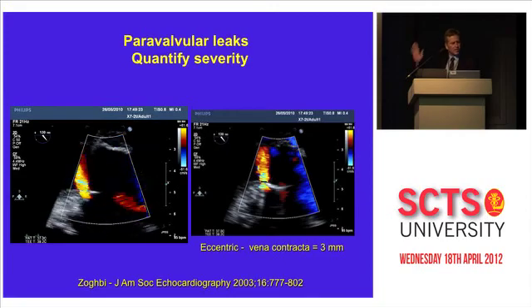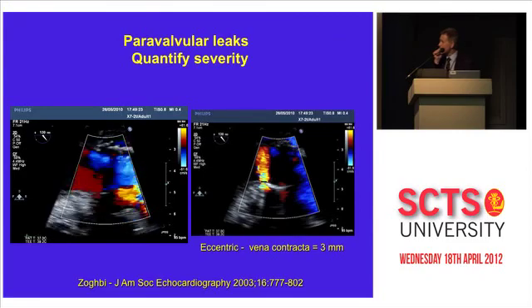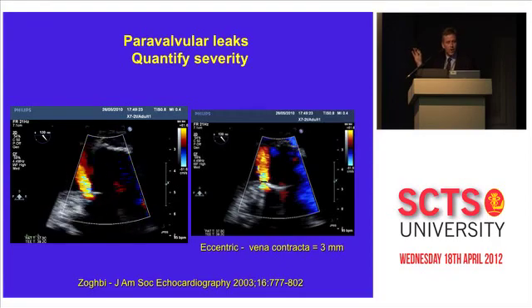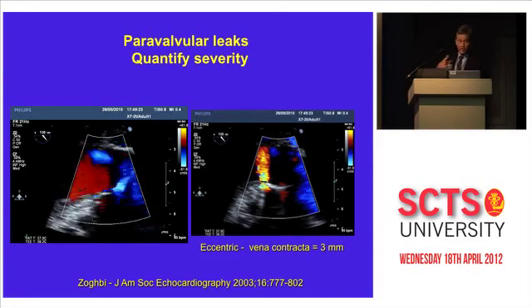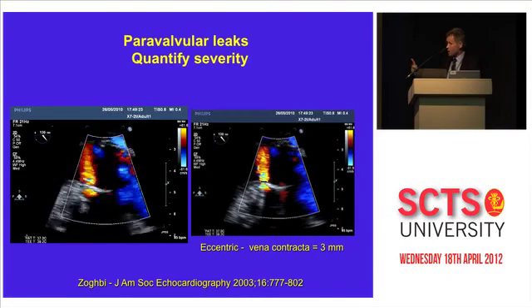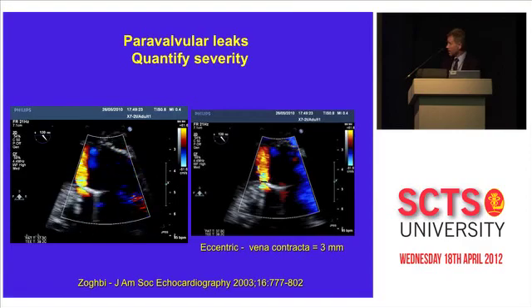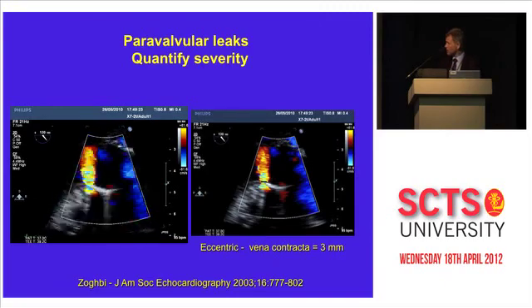First of all, it is eccentric, right diagonally across the outflow tract. So doesn't matter how bad it is, how severe it is, it's going the wrong way. I don't like that because it's going straight onto the anterior leaflet of the mitral valve. And you've probably also seen some patients like that, we have operated on patients with a perforation in the anterior leaflet of the mitral valve when this jet hits it for a month or 2 months or 6 months or a year. So there is a chance that this turbulent flow can cause damage on that side. So therefore, just the direction of this jet is not good enough.